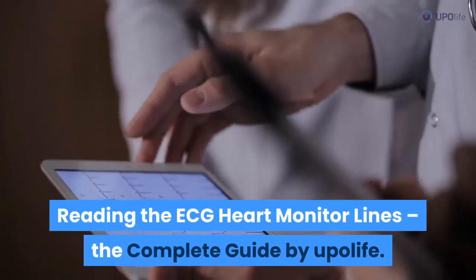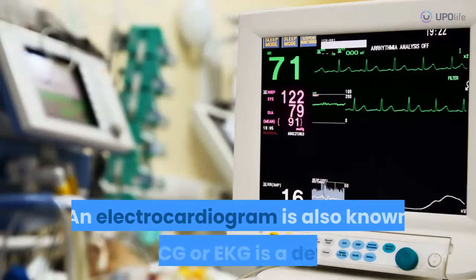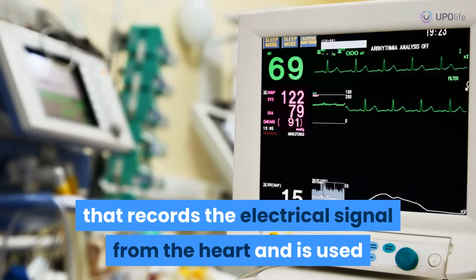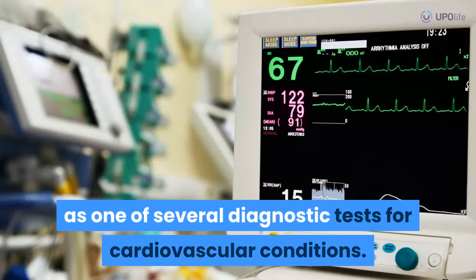Reading the ECG heart monitor lines, the complete guide by UPOlife. An electrocardiogram, also known as ECG or EKG, is a device that records the electrical signal from the heart and is used as one of several diagnostic tests for cardiovascular conditions.